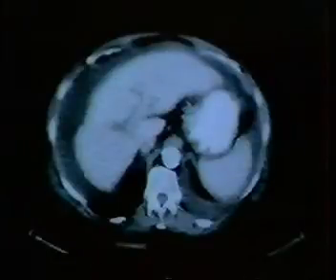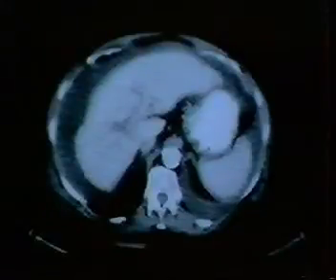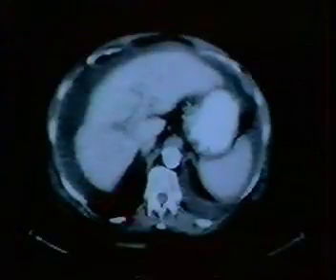Finally, just as a rough rule of thumb, if you just talk about where the fluid distributes, you've got a pretty good way to make a guess whether you're dealing with fluid in the chest or fluid in the abdomen. Particularly in the right upper quadrant, it's very clear that fluid never reaches the farthest posteromedial aspect of the right upper quadrant, and that's because of the bare area of the liver. There's a retroperitoneal space there, not an intraperitoneal space. So intraperitoneal fluid tends to get to about this point, as it has here, and then to progress no further posteromedially. Certainly when you see fluid all the way back in the posteromedial aspect of an upper quadrant, it's almost certainly pleural. Now this is an absolute indicator in the right upper quadrant.